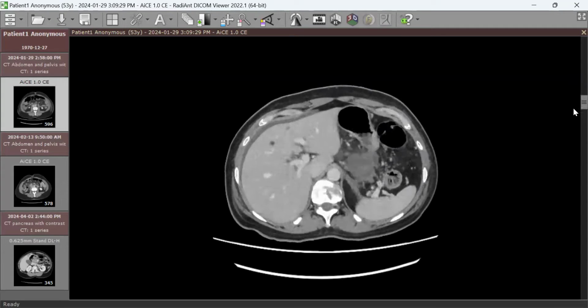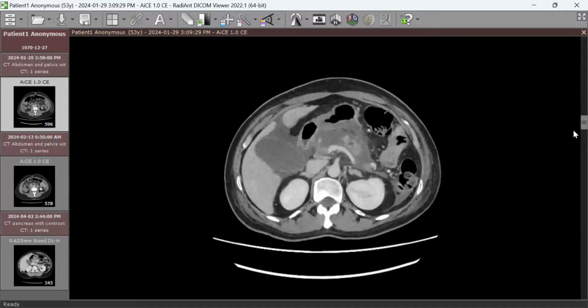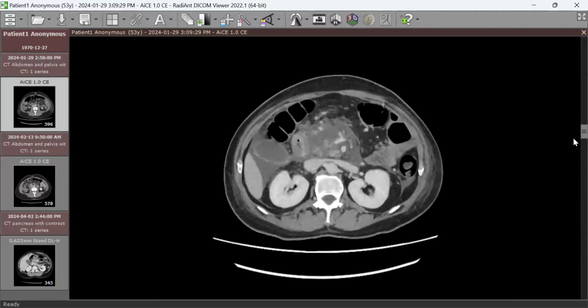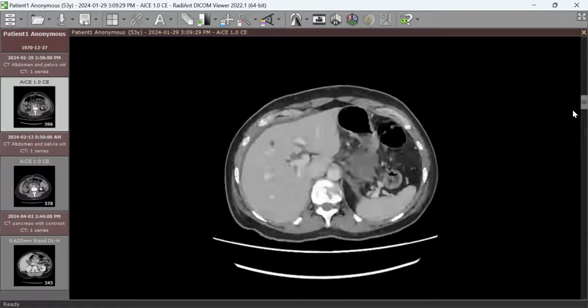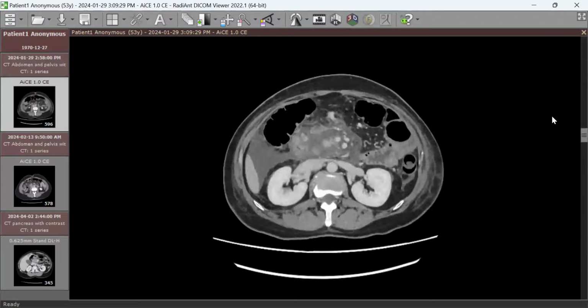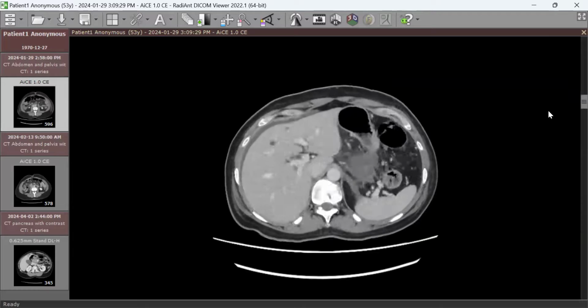Okay, you said periportal edema. Pericholecystic, is that edema or that fluid? Pericholecystic fluid, sorry. Yes, there's a clear fluid, and also fluid around the liver. Also paracolic gutters. Paracolic gutters, yes, right. And also I'll have a look at the pelvic region. Pelvic fluid, yes. So you said the periportal edema. Sorry, I think here is the periportal edema, a little bit.